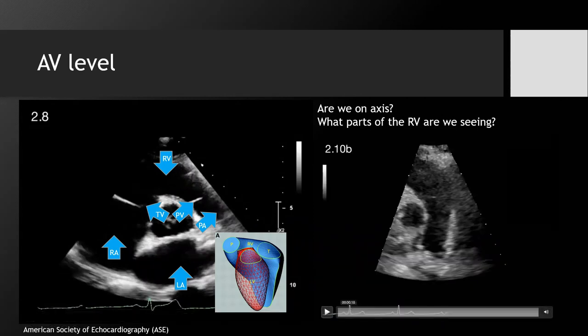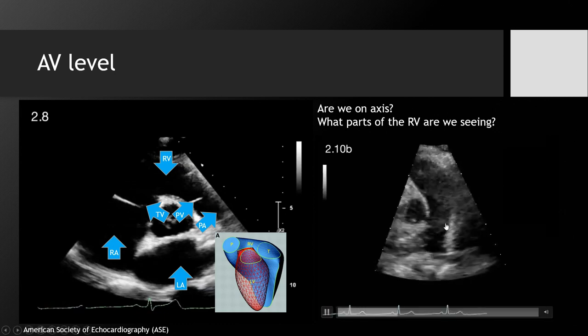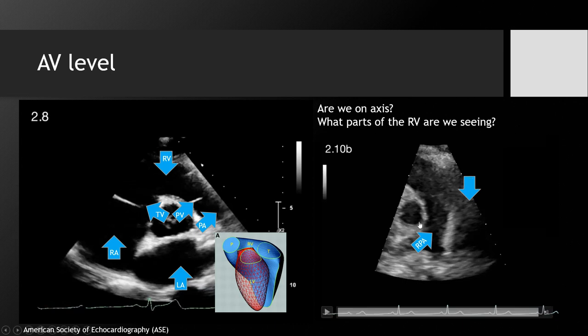Now, moving along, you can notice that if you zoom in, or also on a good day, you're sometimes able to get a good look at the pulmonary artery, and you can even see where it bifurcates and becomes the right pulmonary artery and the left pulmonary artery. This is sometimes called the man with the pants sign, pulmonary arteries bifurcating into right and left. And this is an occasion where sometimes you can even see a saddle pulmonary embolus on this view.